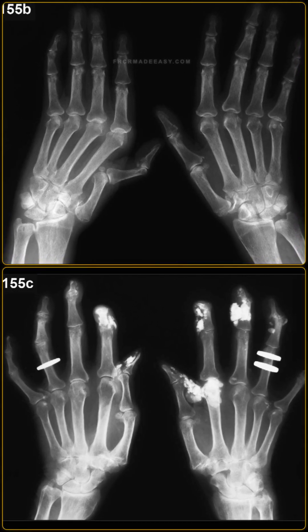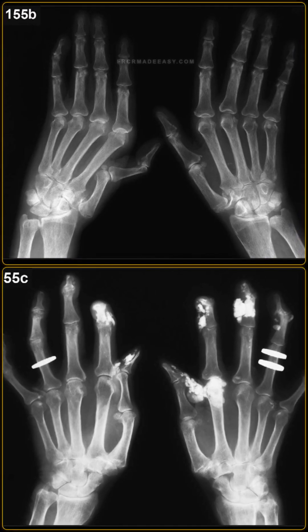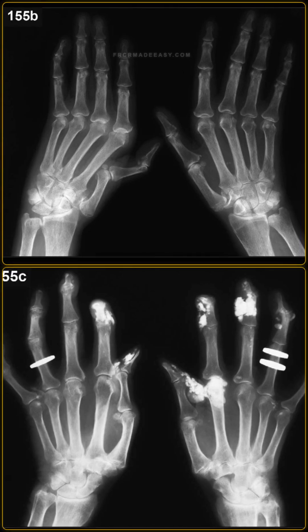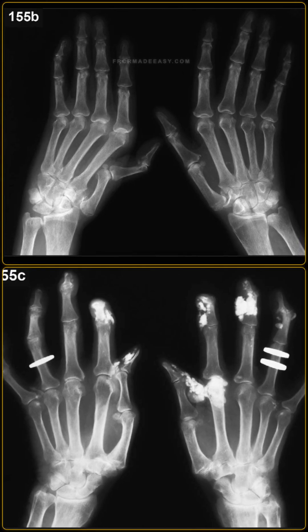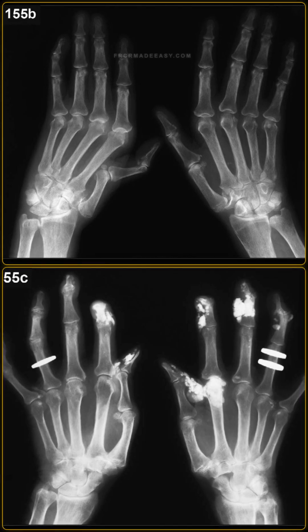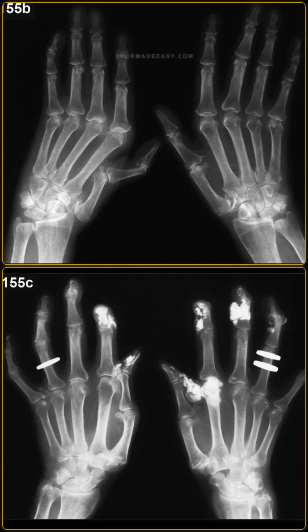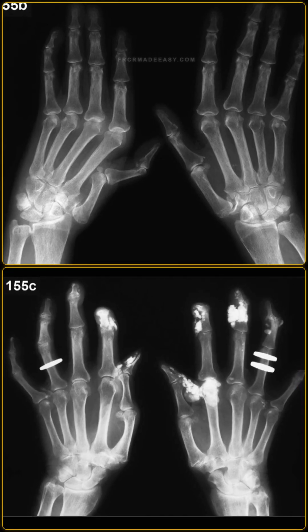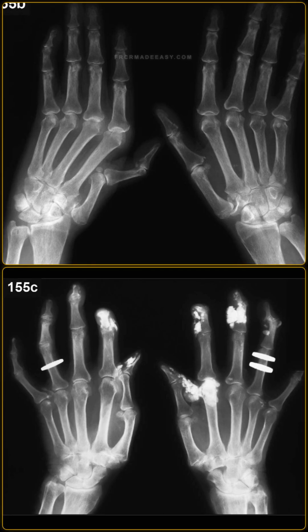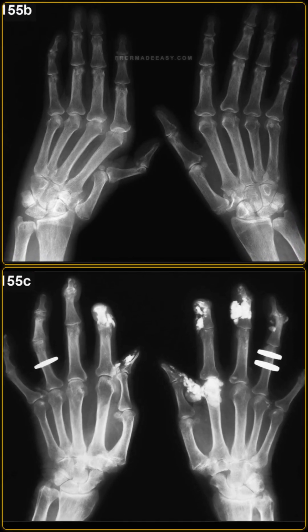The second comparison radiograph demonstrates florid, dense amorphous calcifications within the periarticular soft tissues of the hands and fingers, along with resorption of the distal tufts of the phalanges. This represents scleroderma, where soft tissue calcification, or calcinosis cutis, and acro-osteolysis are classic hallmarks. Discuss the clinical significance of joint deformities in systemic lupus erythematosus and how they differ from rheumatoid arthritis.